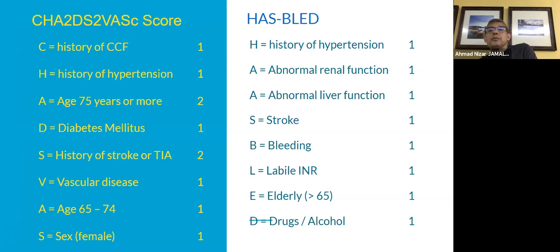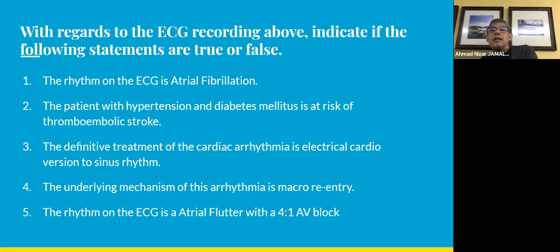With regards to the question, for the ECG recording above, indicate if the following statements are true or false. First, the rhythm on the ECG is atrial fibrillation.